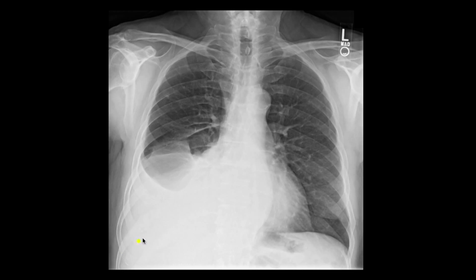Another patient, so again you can see here we have a very large meniscus compatible with pleural fluid, and you can also see this hazy density here. This is usually fluid that layers behind the lung and sometimes can track along in the fissures of the lung. So here we have some fluid tracking along in the oblique fissure of the lung. So a large pleural effusion filling about 50% of the right hemithorax.